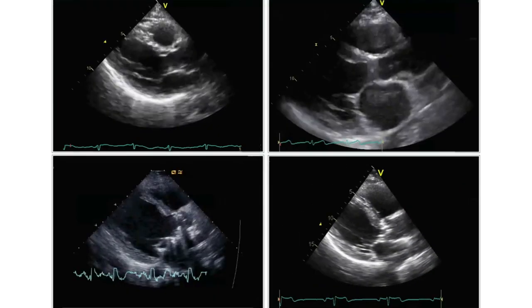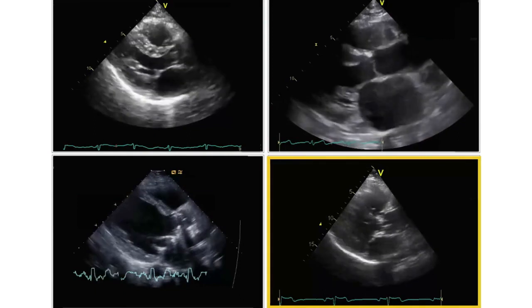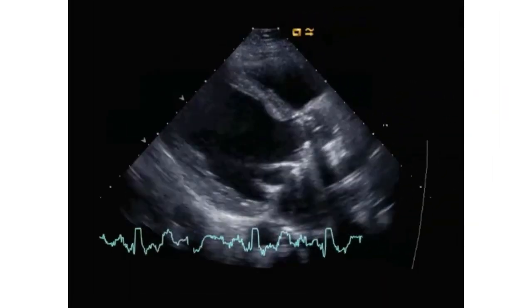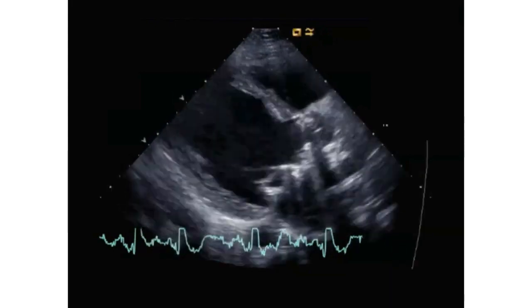Of course, the valve which was stenotic is the last one. But Anna, couldn't it also have been the one here? Doesn't this one also look like an aortic stenosis? I mean, there's a lot of echoes there. It looks calcified. Yes, Thomas, but actually what you are seeing is something else. They are prostheses and rings. We will talk about them later on in our course, so don't worry for now.